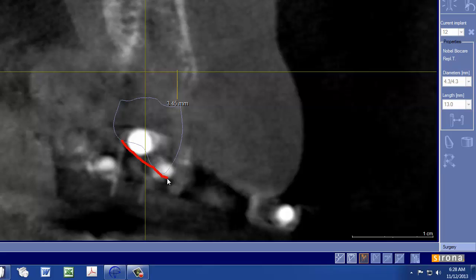Now again, it's overkill, I get it. But the other thing this brings into play is our central groove seems to be right here, correct? Now, this tooth looks like it may be angled that way, and I may have a tendency to plan it incorrectly.